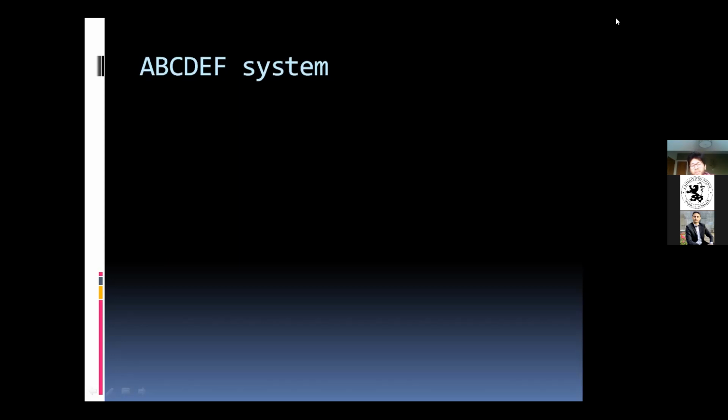So what do I mean by F? I know it's a bit of a weird one to have at the very end because it doesn't really relate to the organ in question that we're looking at. The obvious organs that you can see on a chest X-ray, or the ones that are so big, are of course the lungs and the mediastinum, the bones, the great vessels, the hila of the lungs, the tip of the diaphragm, maybe the liver, and sometimes a bit of the stomach as well.